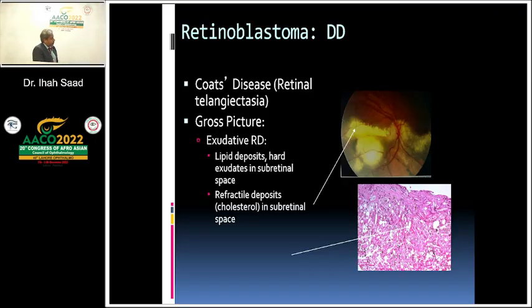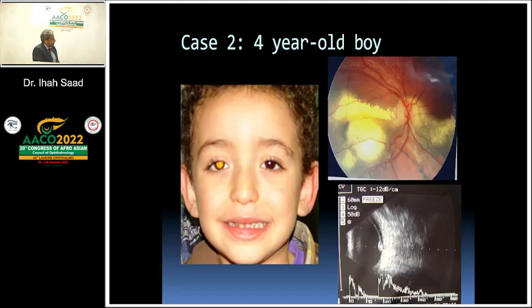So we're having an exudative detachment, lipid deposition, a grayish nodule that mimics a retinoblastoma mass, usually in the macular area, that proves to be a choroidal neovascular membrane, and then the cholesterol crystals within the Coats disease. Also, the reflex here, as you can see, is not leukocoria, it's more like xanthocoria. This is a yellowish pupillary reflex rather than a whitish pupillary reflex.